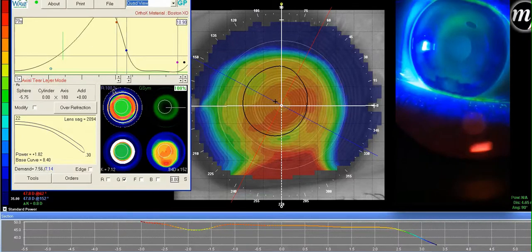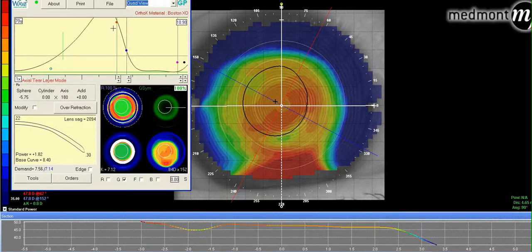So this is the patient's lens, pretty steep case. We're correcting a fair amount of myopia, but we don't have a very flat lens. In these cases, I would probably reduce the OZ a little bit. We're at the conventional 6.2, 6.8, I believe. But I think the patient would get a little bit better uniformity in the optic zone if we can reduce that a little bit.